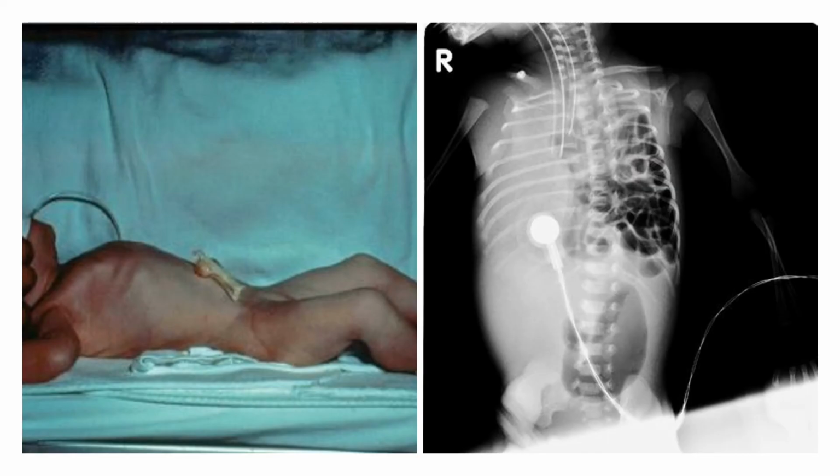All right, so does anyone know what this is? So this is what's called a scaphoid abdomen. You see how this kid's belly is sunken in? So when you see that belly sunken in, that's not normal. Kids should have this poochy Buddha belly going on, right? And so when you see that, it's called the scaphoid abdomen. And so that's not a normal thing. And so what you're looking at over here, this would sort of be the same kid.